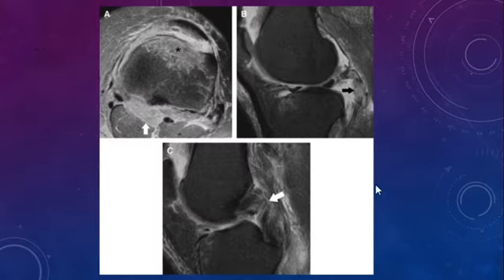For example, just imagine this knee joint being hyperextended. So you will have contusions anteriorly, like here and here also, and you can see posterior edema at the soft tissues of the popliteal fossa due to the distraction injury. Also, you can see here a posterior capsule rupture and the PCL tear at the posterior aspect of the knee joint at the popliteal fossa, because the force is hyperextension, so posteriorly the injuries will happen.